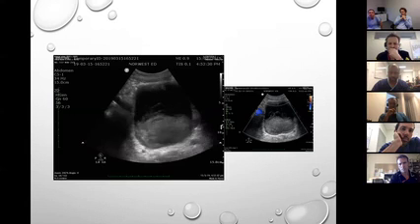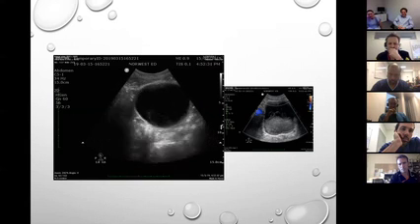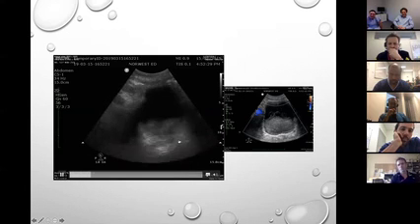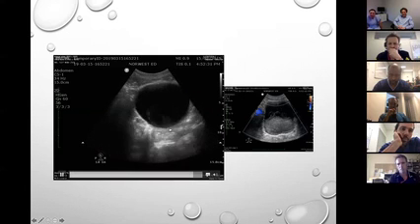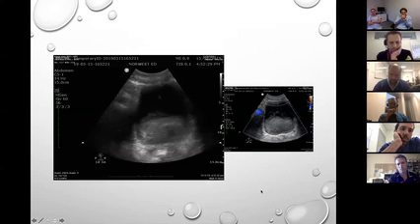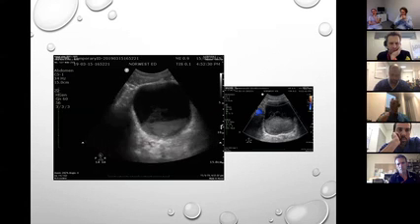The echogenic part of the material in this bladder looks more heterogeneous than in the last image that you showed us. That one was more uniform, wasn't it? But this one has linear anechoic areas in between. What are all these fibrous structures running around? So that could be fibrin strands if it was blood in the bladder.